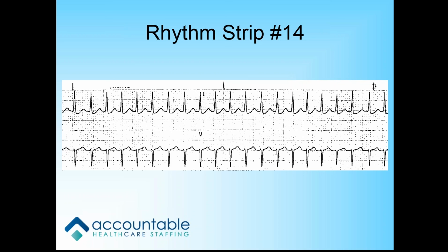Yep, exactly. Okay. And so what we're going by is anything that's greater than 160, we're going to put under that big umbrella of SVT. And then we're going to try to figure out why they're in SVT. So would SVT be the correct answer versus atrial tach? Right. All right. Exactly.